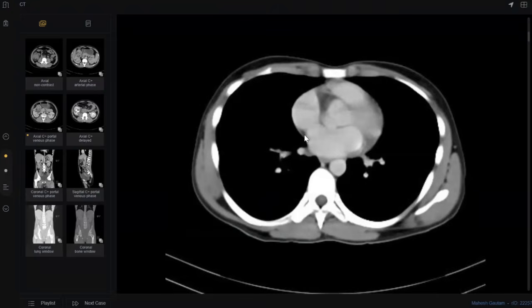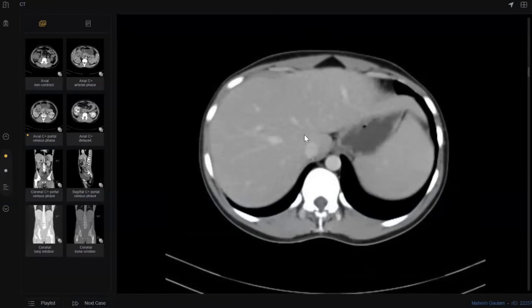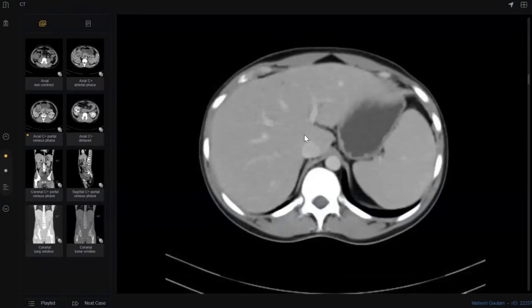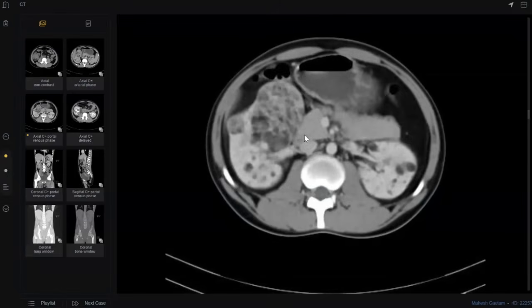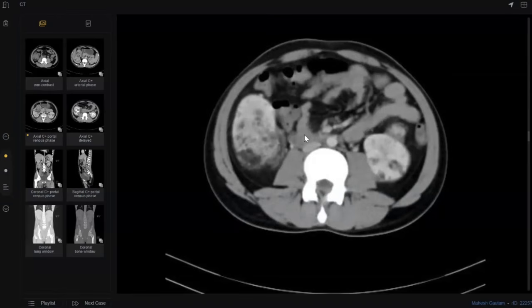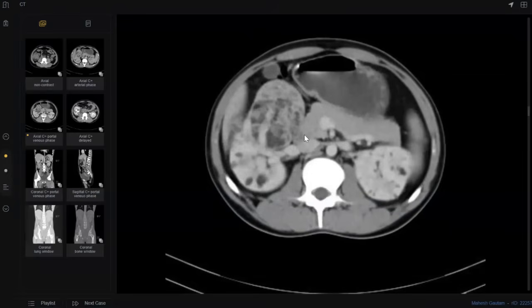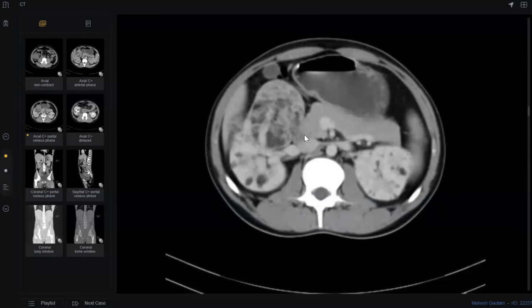These bilateral renal fat-containing lesions are in keeping with bilateral angiomyolipomas. However, the liver appears normal. I'm not able to see any angiomyolipoma in the liver. Could you please show me the upper bigger mass? Yes, I can see that. There are tortuous vessels also leading to this. However, I'm not able to see any cortical breach. No associated perinephric collection noted.